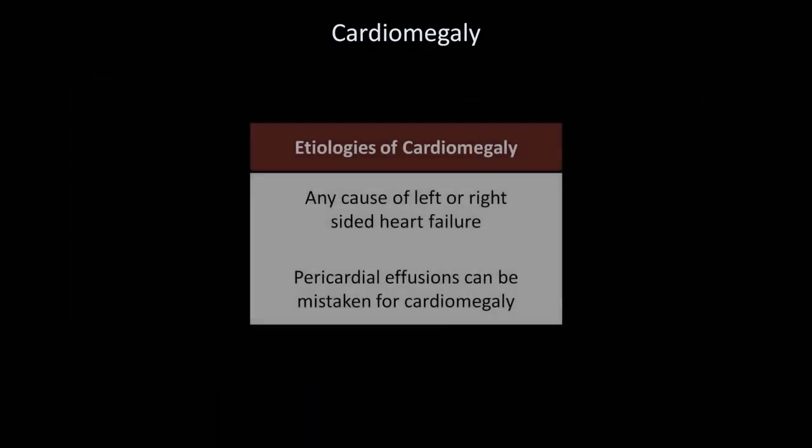As far as the etiologies of cardiomegaly, it can essentially be the consequence of any cause of left or right-sided heart failure. It's important to realize that pericardial effusions, which I'll discuss in a minute, can be indistinguishable from the cardiomegaly that's a consequence of an enlarged heart.